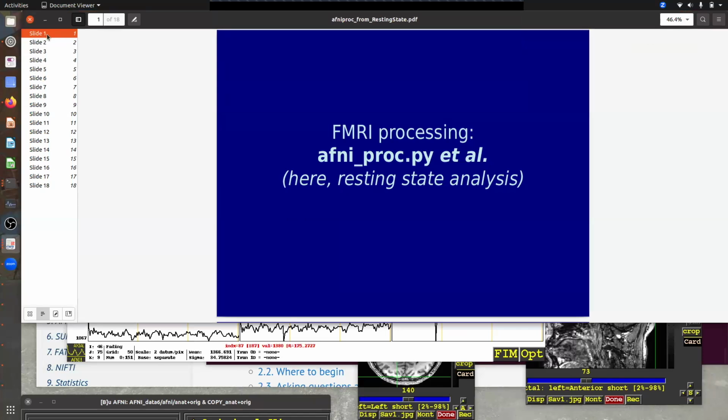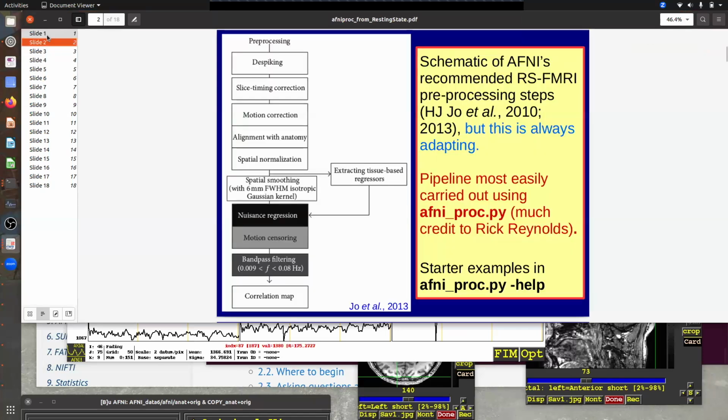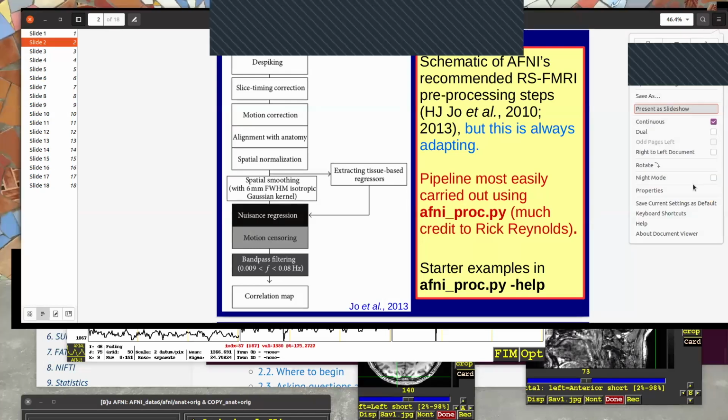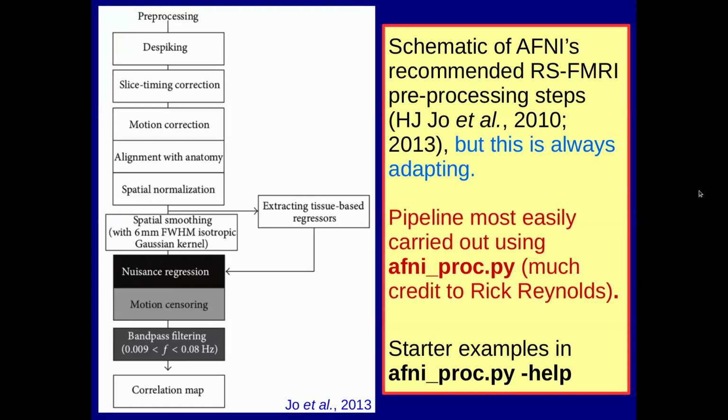Okay, zooming out a little bit here, just to talk about setting up the analysis. Sorry, it's a little chopped off on this screen somehow, but there's not that much missing.